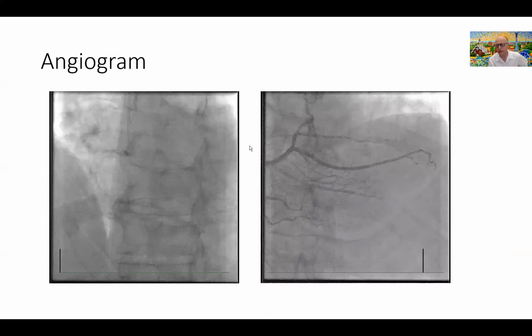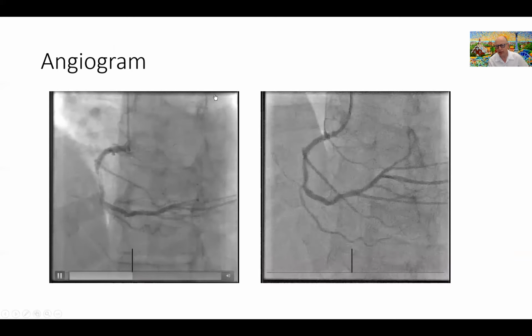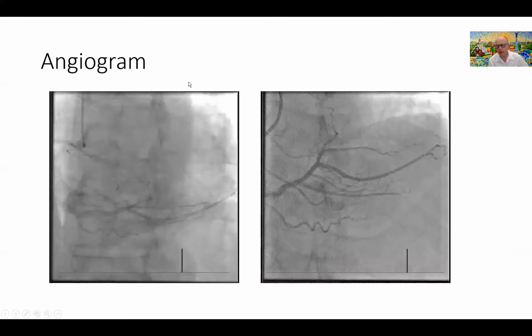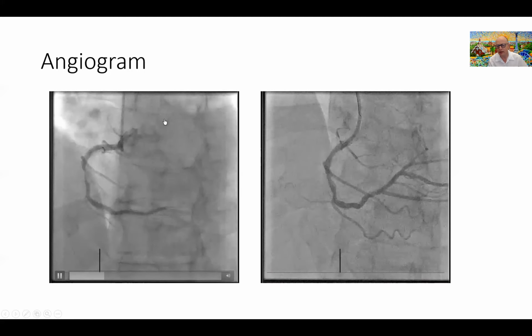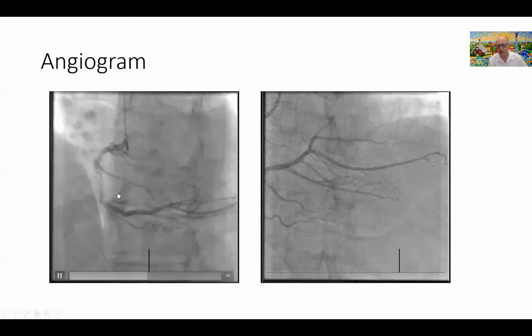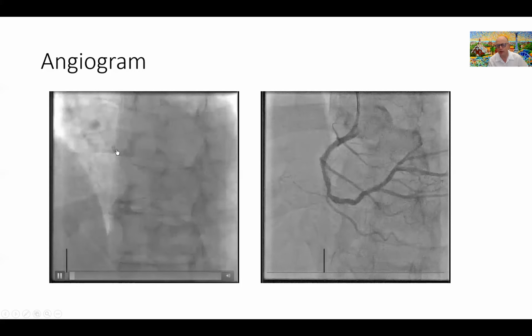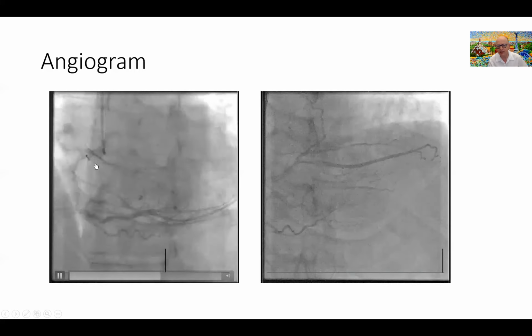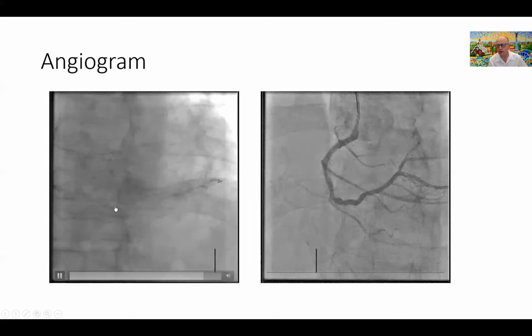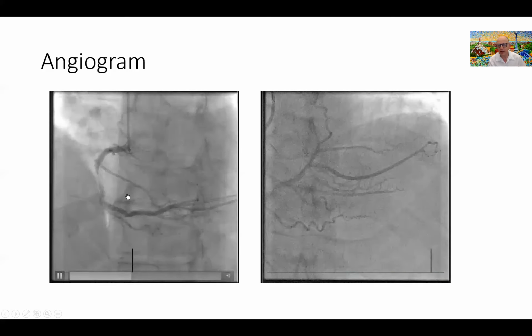This is a patient who presented actually with a cardiac cath and a prior SPECT performed, and the reason nothing was done about the finding here on the left-hand side on the cath is because the SPECT that was done on this patient showed a fixed perfusion defect in the RCA, and the patient was thought not to have any area of ischemia to target with angioplasty. So this was the RCA on this patient.